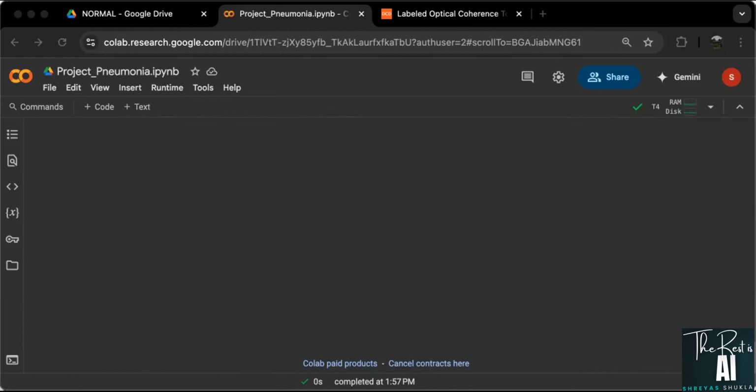Now what we have to do is create the training set and testing set. We have to split that. So what I'll do is create a bunch of empty lists.